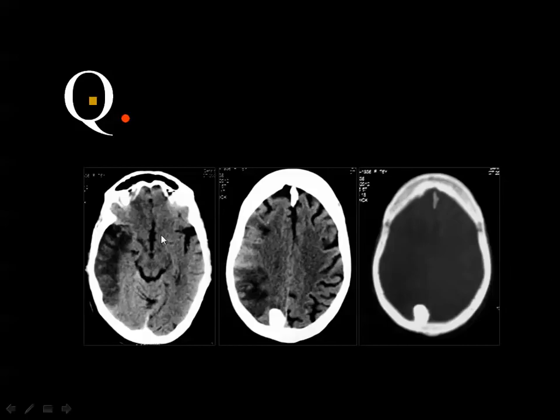Axial CT without contrast, soft tissue and bone window, showing a calcified lesion adherent to the inner table of the skull and a hypodense lesion in the temporal area on the right side. And this is bone. Bone. This is infarction, okay. And then this infarction does not exert a significant mass effect. It may be a subacute infarction.